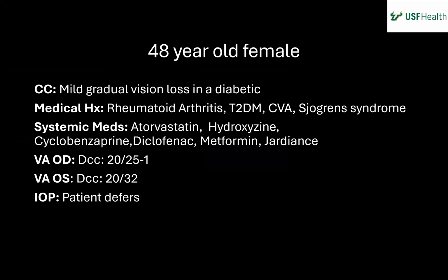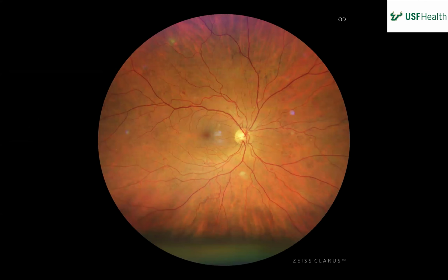Great. Lovely. All right, you're on the first image.